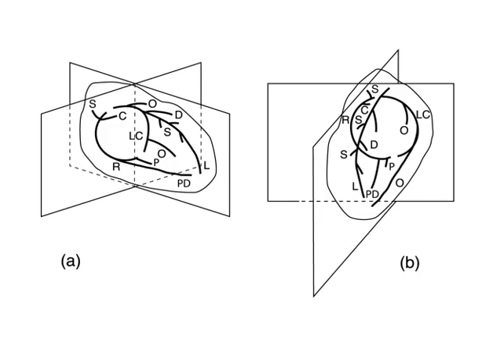So that is pretty convincing, and it should help you understand how the anatomy and the identification of the coronary arteries work.